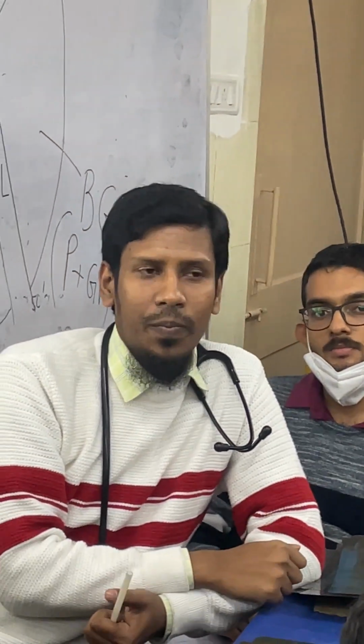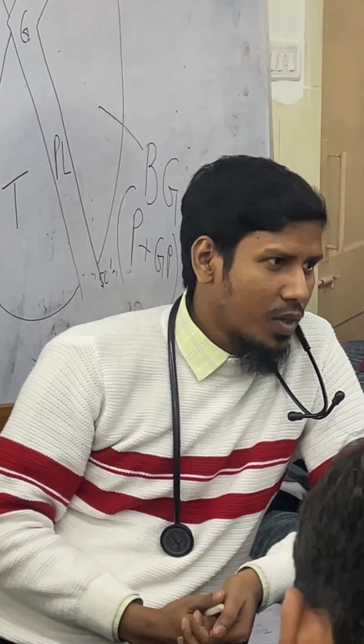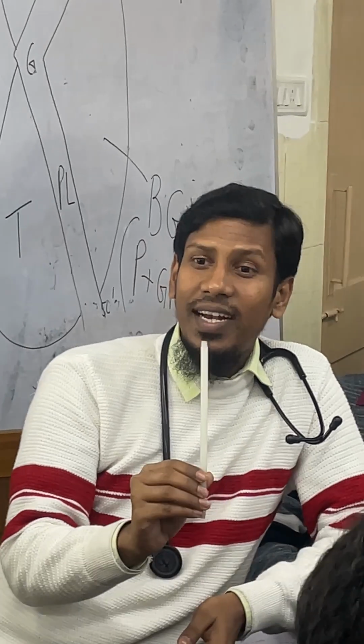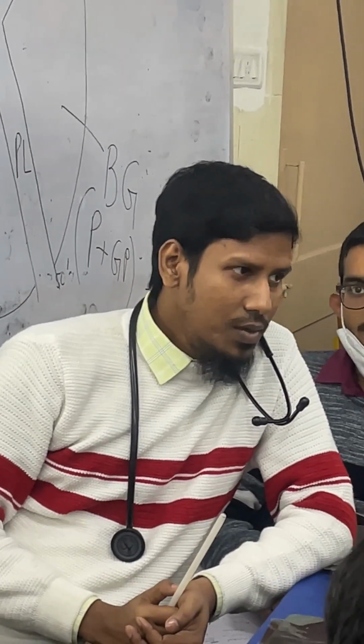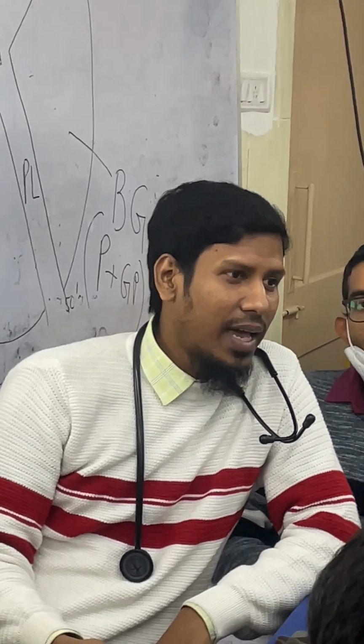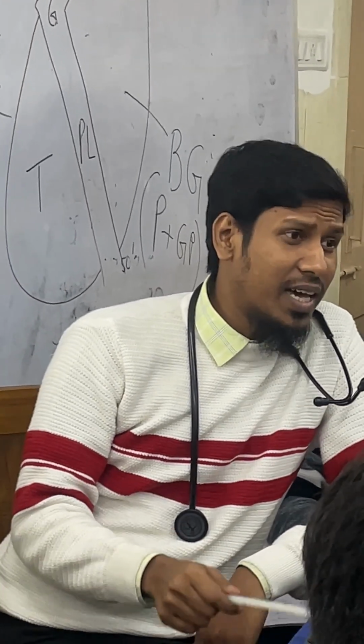So this is the central position of the trachea. If the trachea position gets displaced, then we will interpret it as a pulling or pushing lesion in the lung.